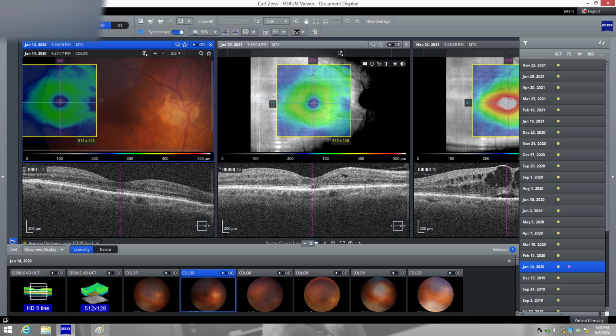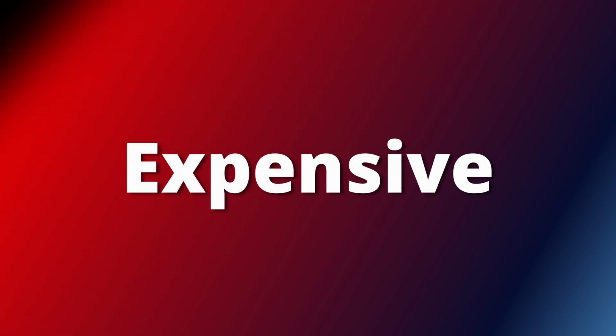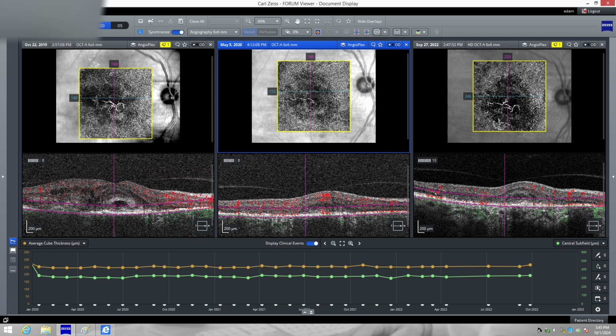So 2 patient visits more for our practice, which makes sense financially to buy yourself that kind of expensive software. And these were basic Forum functionality. Then if you have more money to spend, you can buy yourself Workplaces. And then again, this is a licensed product, so on every computer, you need to choose between different licenses for Workplaces.